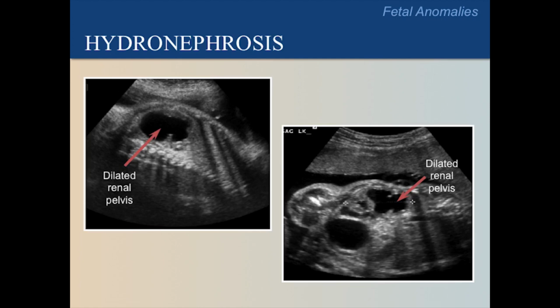How do we know that we are looking at a kidney? The small pyramids or ridges that project into the dilated renal pelvis are typical of the kidney. These ridges may disappear over time as pressure from the blockage slowly destroys the normal kidney tissue.